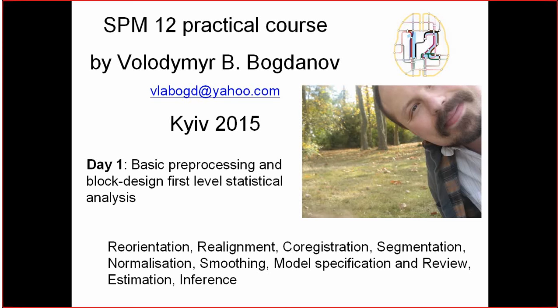And we will try step by step to move through the very basic tutorial of spatial preprocessing and first level statistical analysis of a sample neuroimaging experiment.